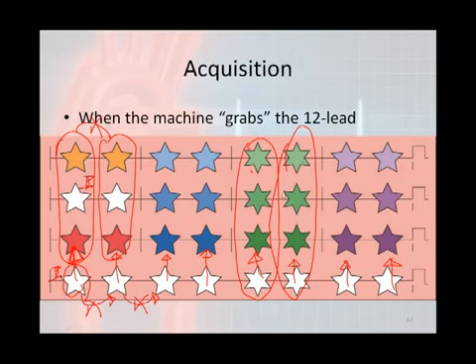It's actually switched. But if you look down here and see what your normal complex is supposed to look like, you can see what happened as it came over here. You had two ectopic beats occur at the exact moment that you were printing V1, V2, and V3, but then you went back to normal. Now, using my rhythm strip, I can say I cannot use these beats in my rhythm or my 12-lead interpretation because they are not normal beats.